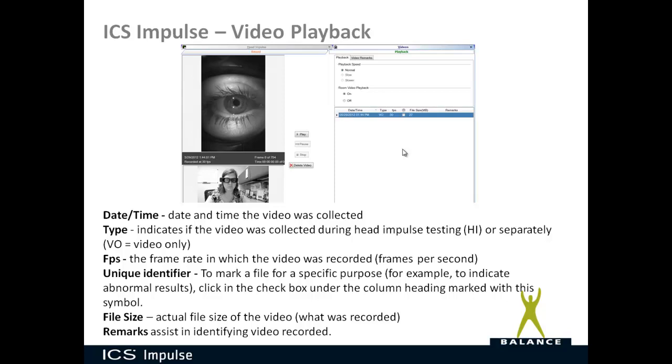Let's talk a little bit about deleting videos. Again, the file size will vary based on how many frames per second you're recording the eye at, whether it's compressed or not compressed, whether you're doing a webcam video along with it, whether it's color or not color, whether it's 15 frames per second or 30 frames per second in the webcam, or whatever frames per second you're using in the eye video.